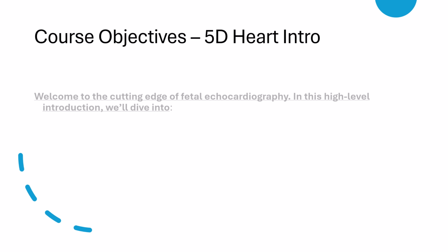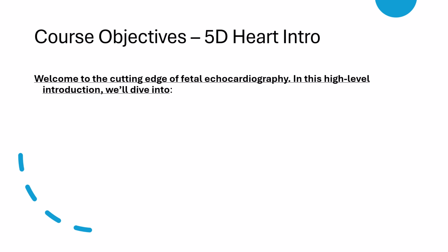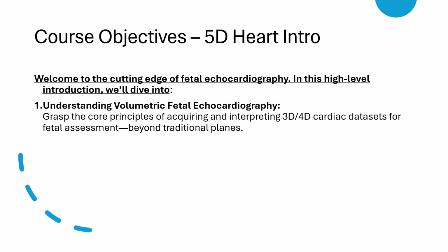Let's begin by outlining the key objectives of this advanced mini course. First, we will gain a solid understanding of volumetric fetal echocardiography. This means stepping beyond the limitation of 2D imaging and exploring how 3D and 4D datasets can be used to evaluate fetal cardiac anatomy dynamically in motion and with a spatial context.